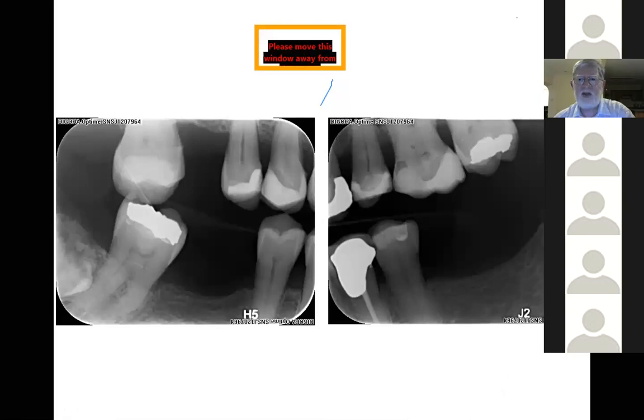Okay, so here we are, look again, that would not be caries. You can see that the material there is too clean cut. So the use of radiolucent liners again underneath there, all of that's a lining, GIC lining most likely, radiolucent, the same thing across there.